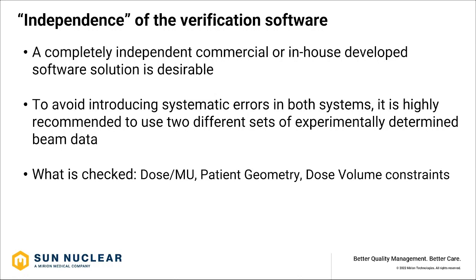The secondary dose MU verification should be able to perform the calculation based on the DICOM planning CT data received from the TPS. Because DVH metrics have been shown to be more sensitive to critical dose errors than just looking at a single point dose verification or gamma passing rate, ideally the independent verification software should also be able to provide DVH curves of the targets and organs at risk.